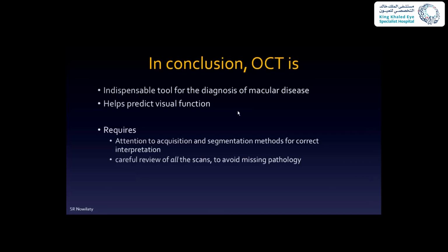But usually most of the time we just do a macular OCT, okay? So understand the macular function and the macular pathology. It shows you also whether the macular function is equivalent to what you expect. When you see certain structures on the OCT, you can more or less predict the acuity of the eye just by looking at the structures, if they're intact or not, okay?